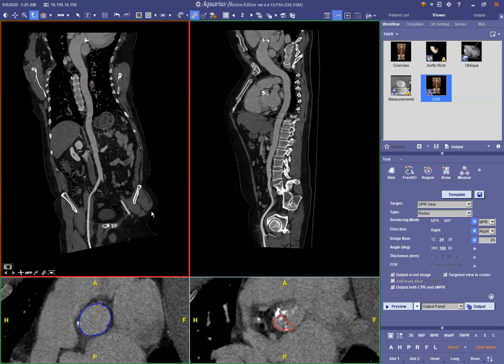Again, I've picked out the appropriate tool. In this case, I think it's just the distance pair tool. Left click that, and then on the cross section is where we want to left click to activate. So we get the measurement. They're already pre-labeled as far as the variables, and then C to capture. And then we'll just maintain that same label, hit OK.